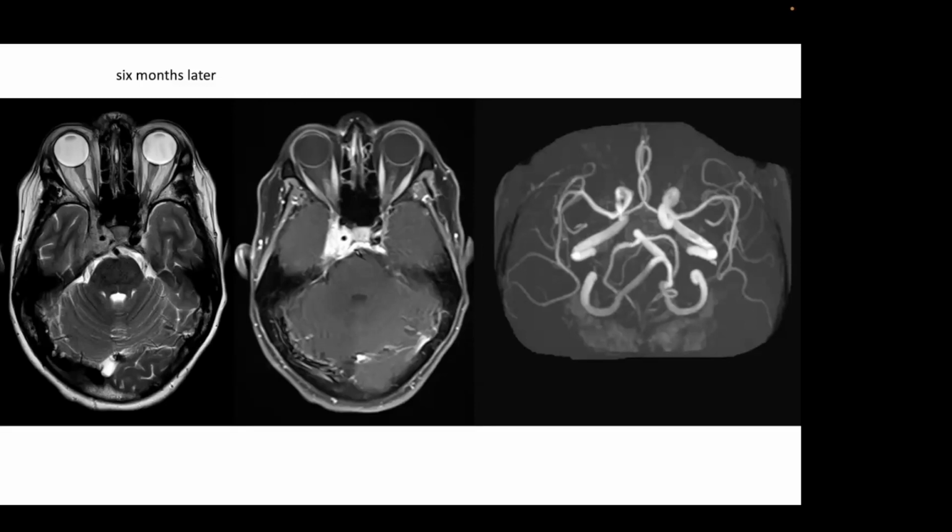But I think the imaging here, especially since we know this has been present for months, the stability of it would favor a neoplasm rather than Tolosa-Hunt, which is a transitory phenomenon. And remember, the clinical history will help you, because Tolosa-Hunt is classically associated with a kind of stabbing pain, and often it extends into the orbit a little bit. But I'm glad you brought that up. So it's in the differential of the low signal intensity cavernous sinus mass.